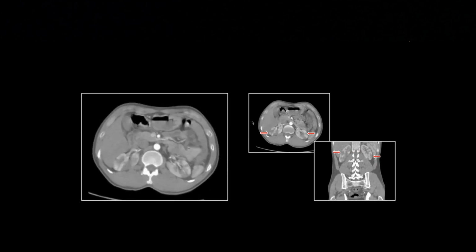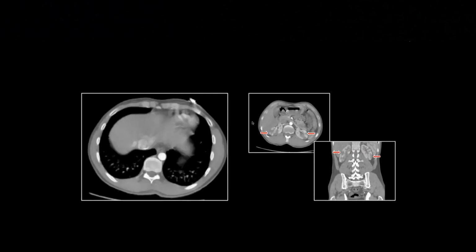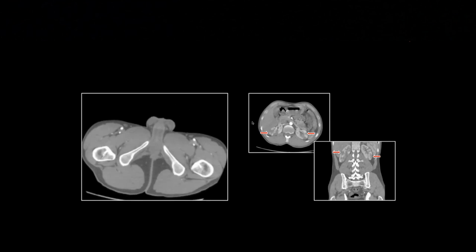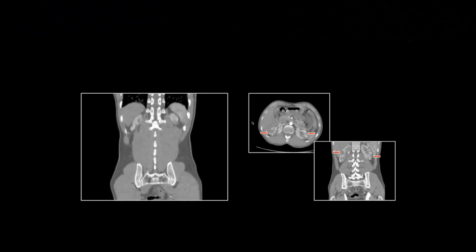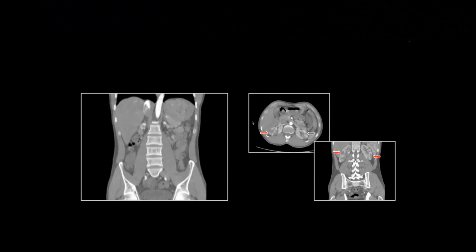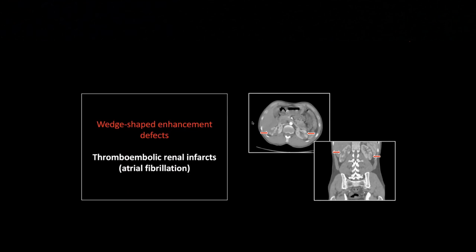So there they are. Pretty neat to have just witnessed the whole sequence of events and know exactly what had led to this. So incredibly, this was my lesson that carotid massage can in fact work on occasion. Pretty big one in that right kidney. You can see there's a pretty significant chunk of cortex taken out there in the medial inferior aspect of the right kidney. All right, that is converted atrial fibrillation resulting in bilateral renal infarcts.